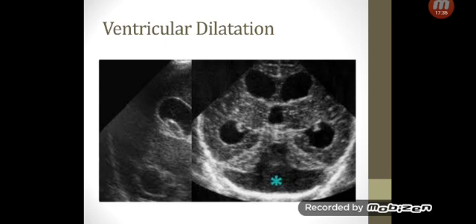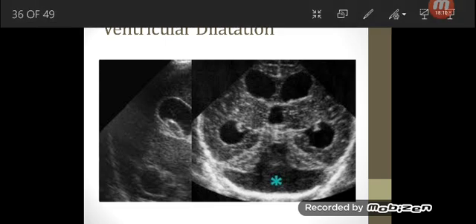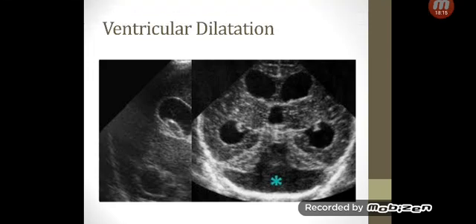So this is how cool cranial ultrasound can be. Just a scan, even if you're not an experienced radiographer, you can appreciate that there's something missing here. If you revise the first lecture, you would understand that this is where the cerebellum should be, and that will get you the diagnosis. So this is a Dandy-Walker malformation: absence of the vermis and opening of the cisterna magna with the fourth ventricle in the same field, causing disturbance with the whole ventricular system, getting to this image of full-blown hydrocephalus.